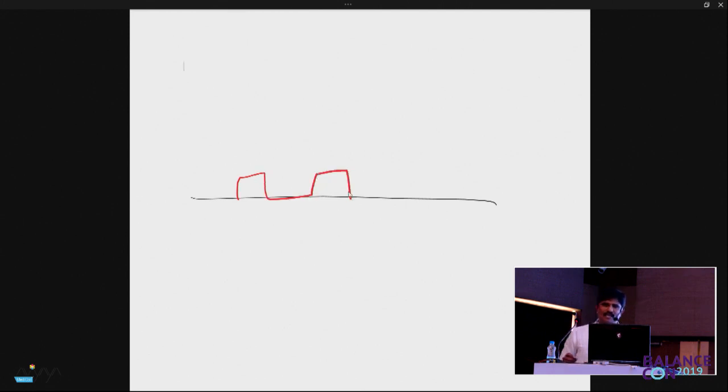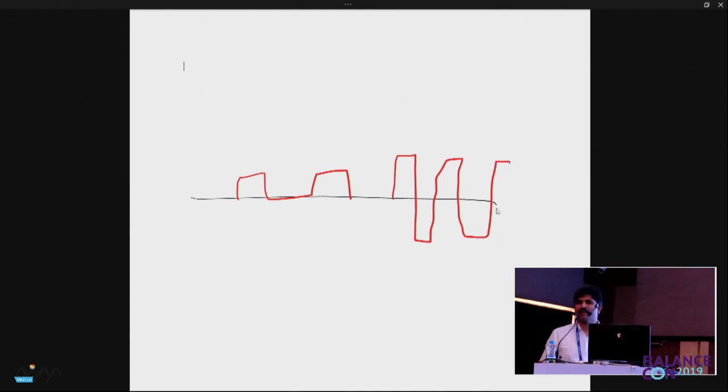Whereas, if it is an oscillation, something called the third one, macrosaccadic oscillations, you see the picture on the next sheet. What you see here is, if there is a point of fixation, it goes to one side, then it goes back and forth around the intended point of fixation. So this will be a macrosaccadic oscillation. This is the next word that we need to understand when it comes to videonystagmography interpretation. Fine.